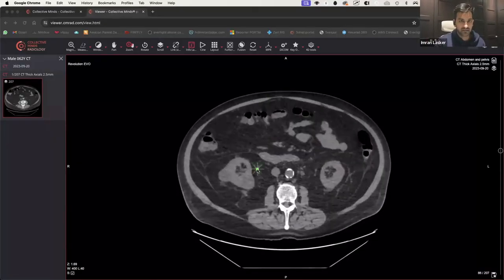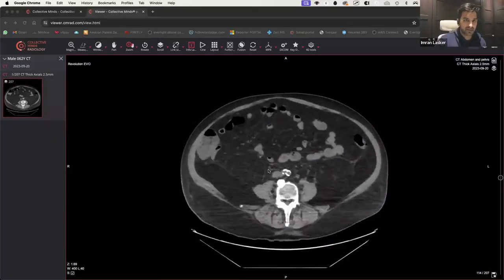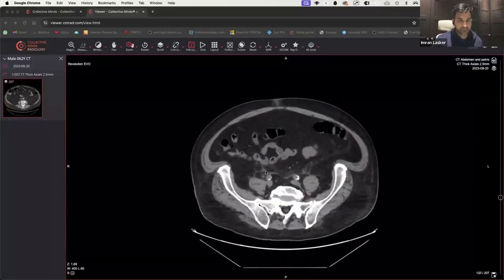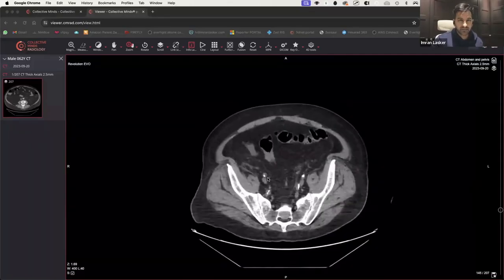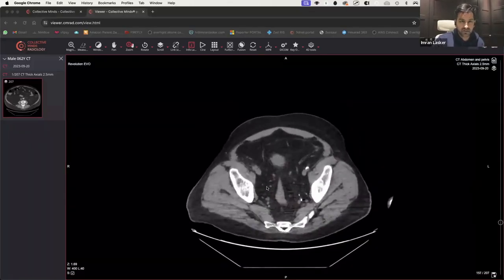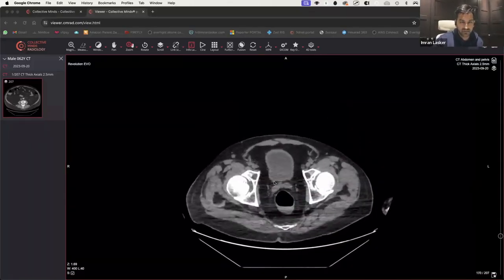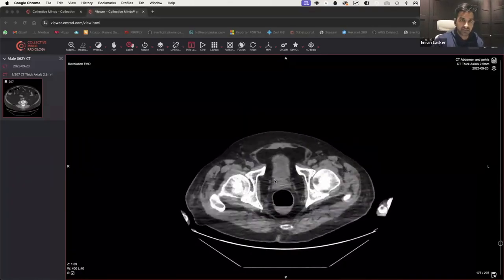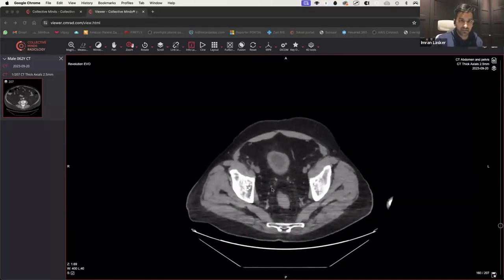So that's the ureter, I think, there. Let's try and follow it down. And this does take a bit of practice. Over time, what you notice is that your eyes almost assume you know where it's going to go. Like I know that's probably going to be somewhere here. And if you ever get lost, my big recommendation is go from the bottom. So it's going to be the vesicoureteric junction. You're coming up, you can see that ureter that way.